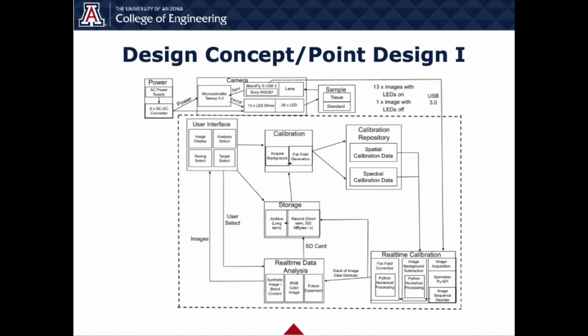We are done with our images, which then go into our real-time data analysis, which will actually create the physiological data. All these images are then shown in our user interface, which is controlled by the user, and the user can choose which functions to apply and not to apply to our system.